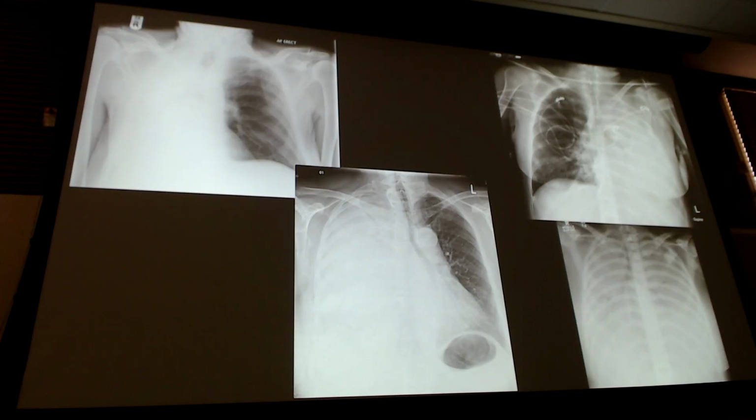What about this guy up here? What's causing this entire opacified lung? What do we think? So that one's going to be a pneumonia. I have centered structures. They're not being pulled one way or the other. And I kind of got a little air bronchogram kind of going on down over here too. Right? Okay, I can see the main bronchi, but then look at all the little guys. Look at all the tree branches I see. So there's my air bronchogram as well.